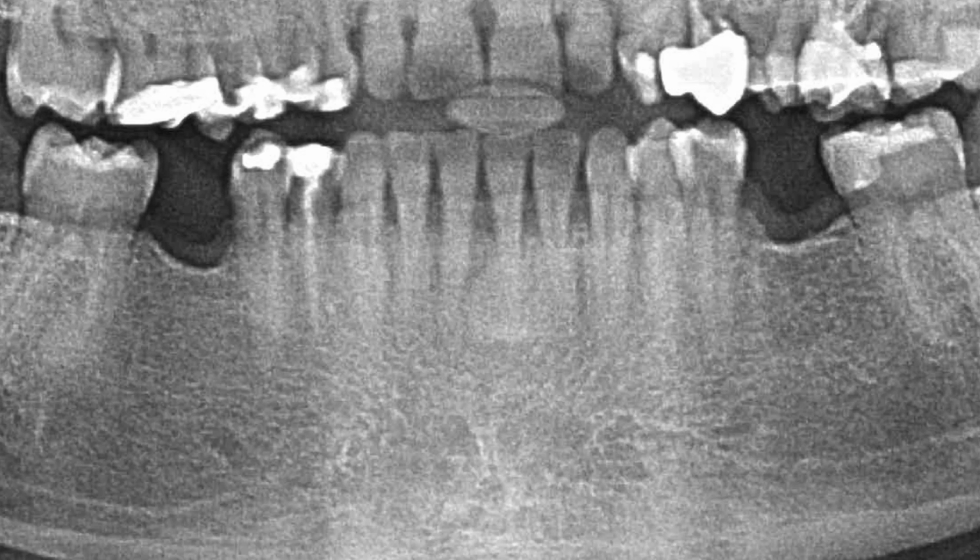If there's anything that stands out, just try to keep that in mind before I show a periapical radiograph of this area. I think you'll be surprised to find the differences between the panoramic image and how it appears on periapical radiograph, or in this case we have sort of an occlusal radiograph of the area.